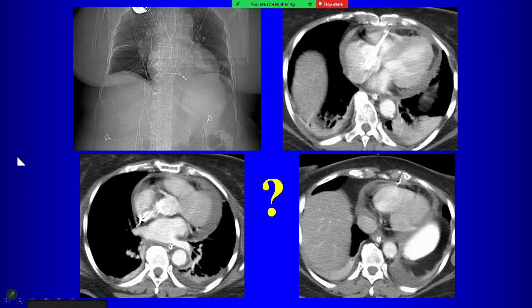Is there a problem here? Here's a pericardial hematoma. How about in the context of the images? The lead pierced through the myocardium. Can you see it? On the top right image, I think the lead is piercing through the right ventricle. What about the last image? Last image. Yeah. This guy right there, outside. There's the lead tip right there.